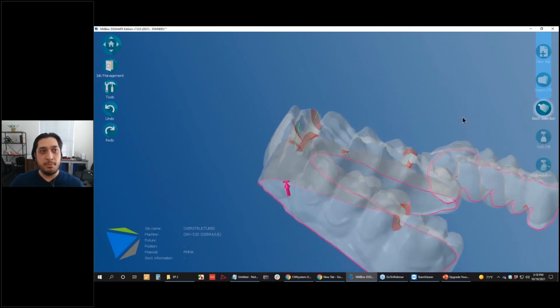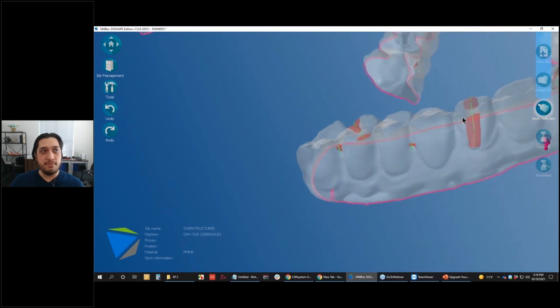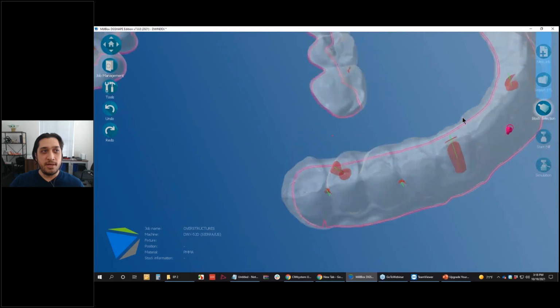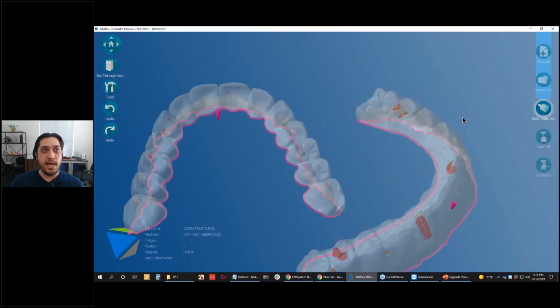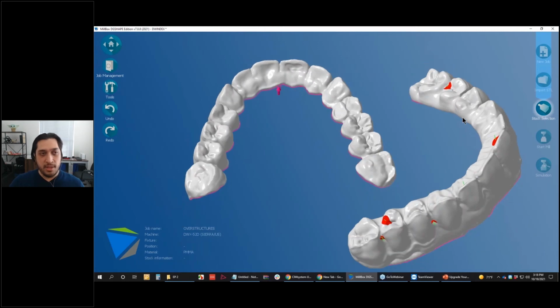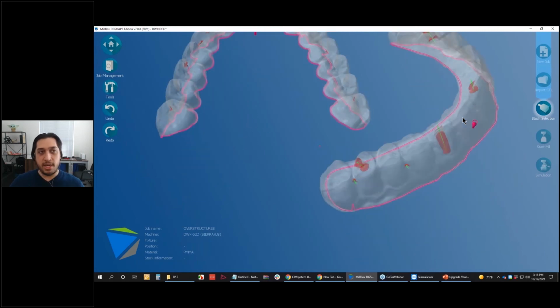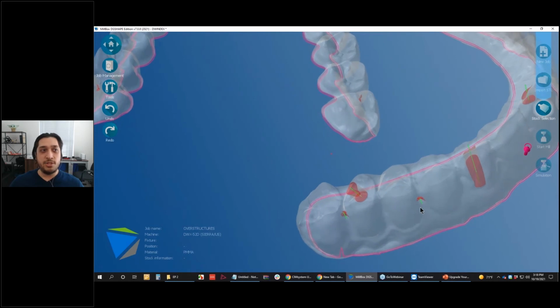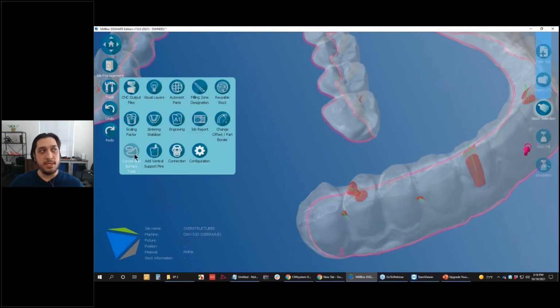So with hybrid abutments, you have those 3 criteria for processing cases. Oh, looks like we actually have another 2 drilling axes that are not actually there that we're going to want to fix as well. And again, I'm glad this is happening so I can show you guys the import automation works really well, say 90% of the time, but sometimes we can have these issues where it's detected additional axes or additional surfaces we need to get rid of.